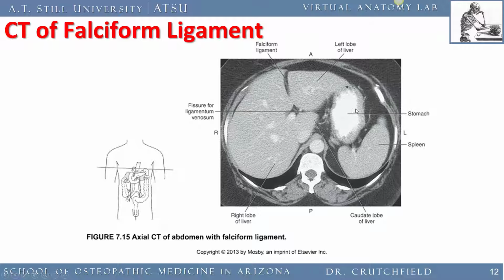Barium can get stuck, so we don't like to use barium, and if we do, it's dilute barium. So, of course, we have the spleen here. Here is a little bit of adrenal gland. Here's aorta, and here's right lobe of the liver. And this is the surgical right lobe of the liver. This is the left lobe of the liver, and it's divided right here by the falciform ligament.